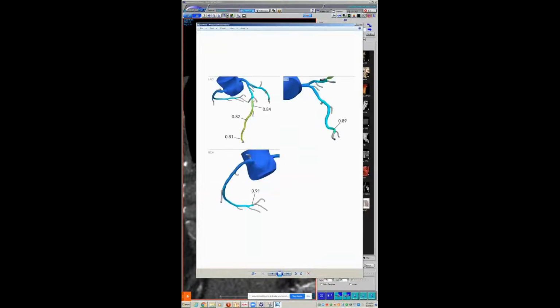And you can see that despite the stenosis being extraordinarily tight on their recon, which it is on the CT, there's no hemodynamically significant stenosis, at least on the CT-FFR. And when we looked at the so-called equivocal stress test, about 2 months before, there wasn't any perfusion abnormality in the LAD territory. There's something along the inferior wall that they thought was breast attenuation or something.